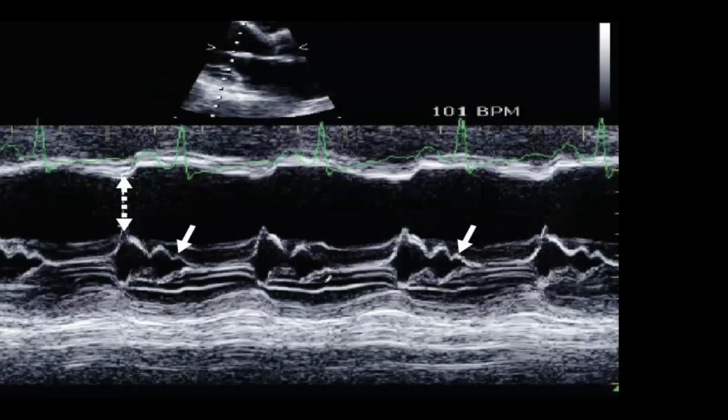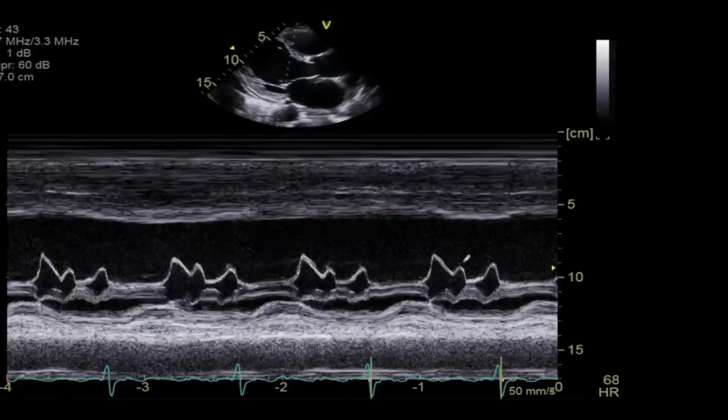Septal separation, decreasing contraction, dilated ventricle. Yeah. So first of all, as Dr. Chow was saying, there is a dilated ventricle. We call this E-point septal separation, which we don't use anymore. And the most important thing is the hemodynamic part of it, the B bump or B hump, which indicates high pressures, like the LA pressure is really high. So it is still pumping blood even during or after the atrial contraction. It's supposed to be emptying now.